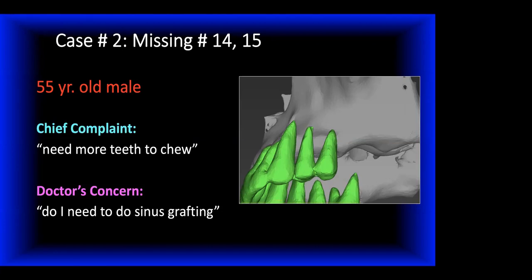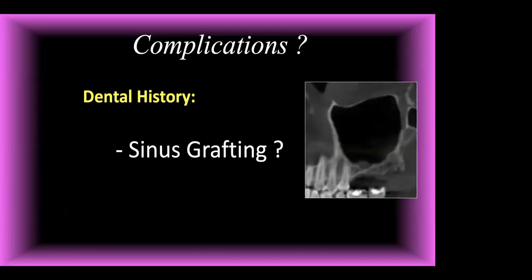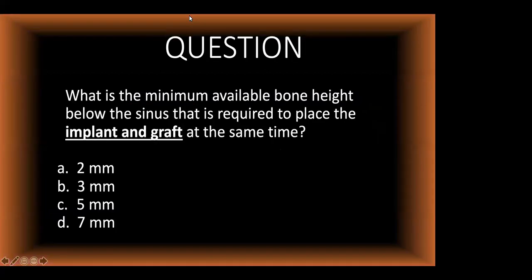So the doctor's concern is, do I need to do sinus grafting? So let's take a look at it. When I see that dental history and I see the CBCT, do we need sinus grafting? Well, you have to know how to read the CT scan to determine that. Also, you have to know the pathology involved with it. So I'm going to go very in-depth into this.